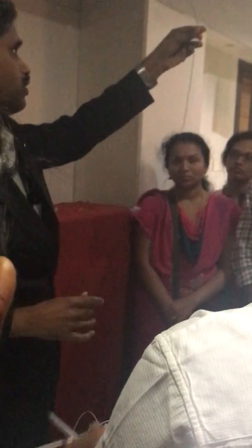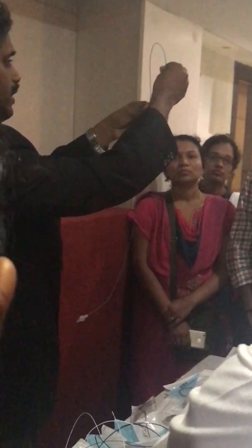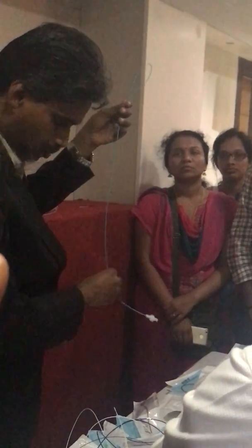This one is not commonly used, but can be kept in the exam. What is this catheter? Robertson. Very good. So this is a Roberts uterine catheter, which will have a very long handle like this. Okay. So this is a Roberts catheter.